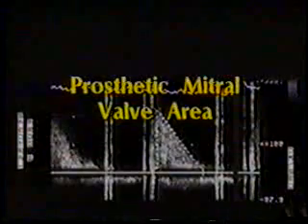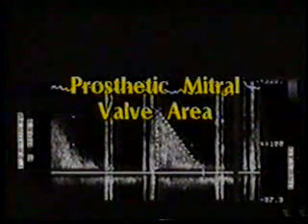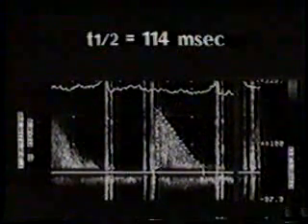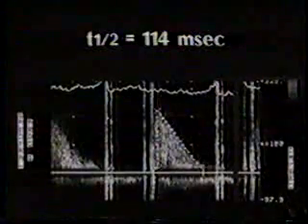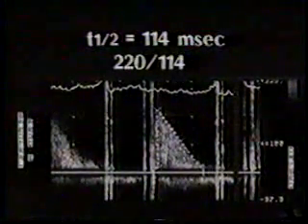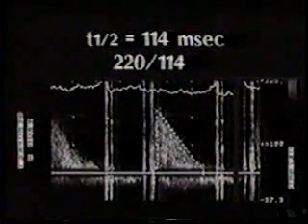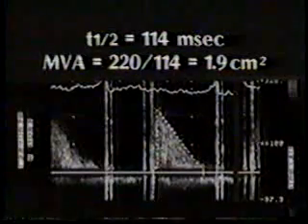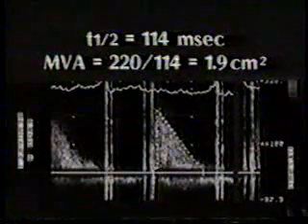By analogy with stenosis of the native mitral valve, prosthetic mitral valve areas have traditionally been calculated using the pressure half-time method. For this same Bjork-Schiley mitral prosthesis, the deceleration slope has been traced. The pressure half-time is 114 milliseconds. The constant, 220, is divided by this pressure half-time, which yields a prosthetic mitral valve area of 1.9 square centimeters.